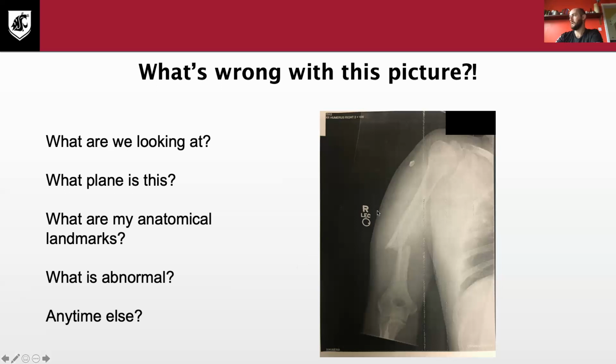Is there anything else you guys can identify on this? We have some shading right here. What could that be? It's most likely the hematoma forming. So you can see some skin. It's clearly the most outer border of my body. And then we'll most likely have fat. And what x-rays are really good for are just bones. You're going to get that shading, and that's most likely going to be blood that's impacting the image, or very, very dense fat, which still provides some density, but you're not going to see as much.